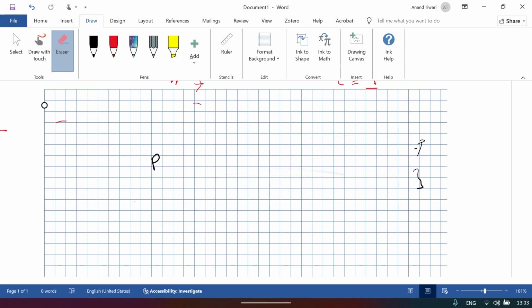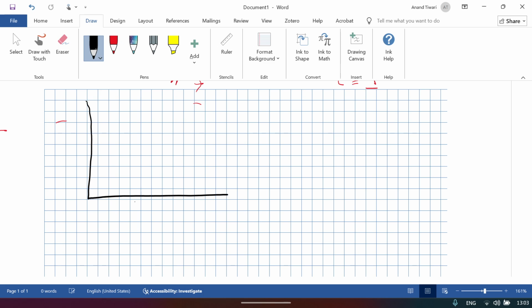Next we'll discuss the important flow time curve. I'll be more interested in the expiratory limb of the flow time curve. This y-axis shows the flow, and on this x-axis we have time, and we see that this is a constant flow pattern.